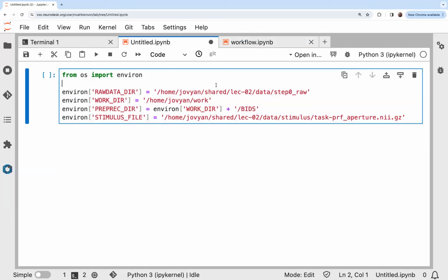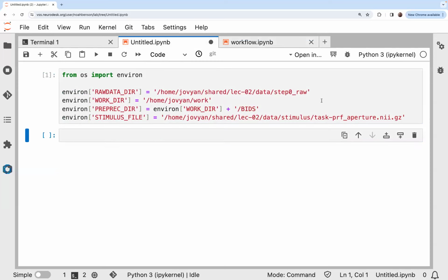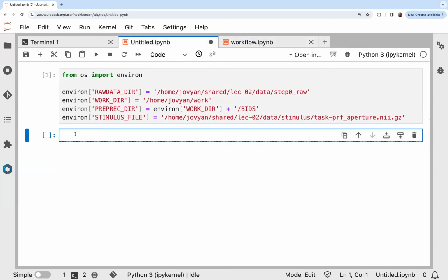And when you've typed all these lines, you can go ahead and push Shift-Enter, and that will run this cell, and you can tell it's run because it's now got a little 1 by it. Okay. There are a few other items in the actual workflow notebook that are configured there, but we won't need them in this workshop. So if you go review this later, there are explanations there about what they mean.